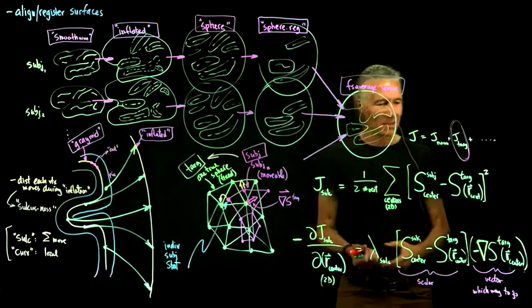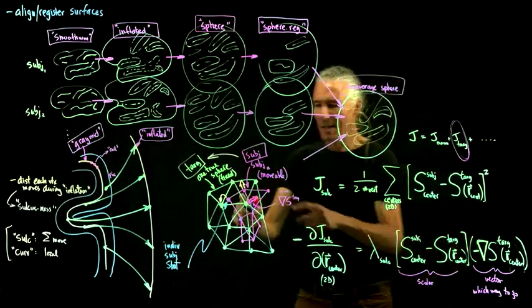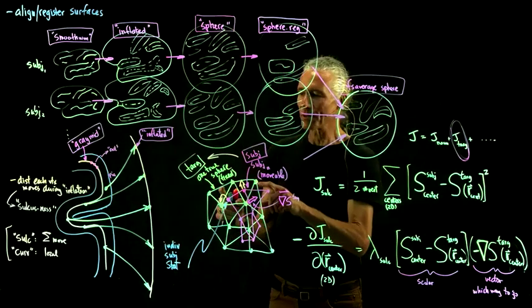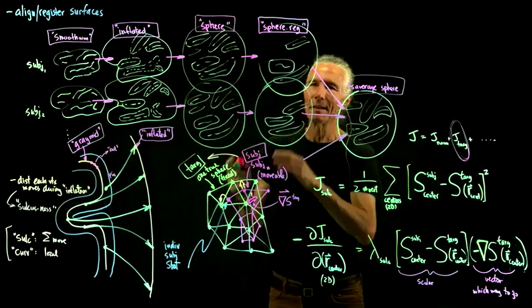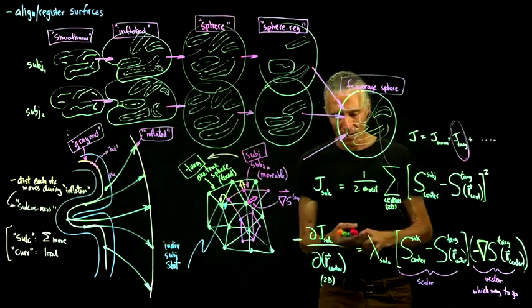But then, if you do that, you basically just run this, then you can essentially get this red surface as aligned as possible to the one true surface. And then after you've done that, you can start sampling data onto this surface. And what will you end up with?